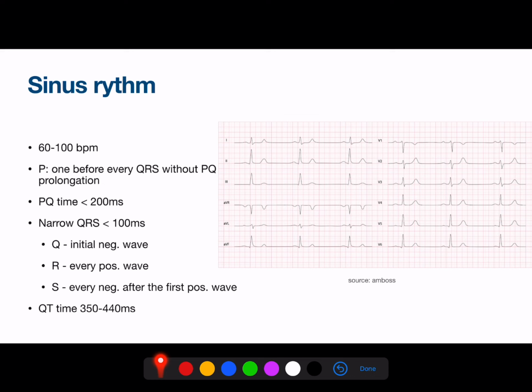You can count the squares and or use the paper and mark 2 QRS complexes and move along with every QRS complex and see if it's regular. You can do it when you're in the clinic.